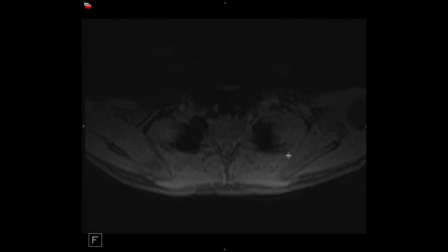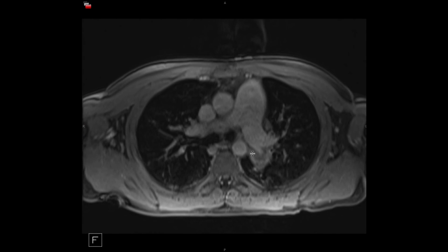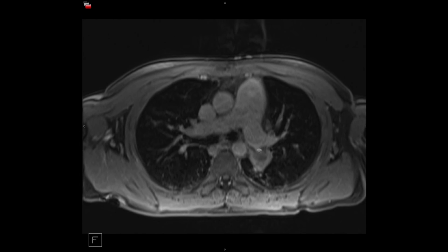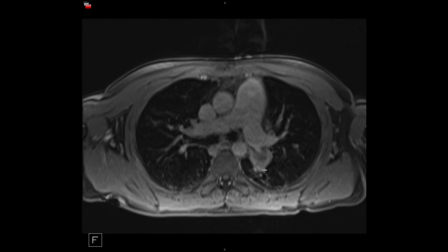Now, after the time-resolved MRA, this patient then had a standard MRA sequence in the axial plane where you can actually see the chronic PE itself that we also pointed out on the bright blood non-contrast sequences, but here you can see it here. Sometimes it's more difficult in an MRI because the thrombus has bright T1 signal. But you can see here, this is thrombus.